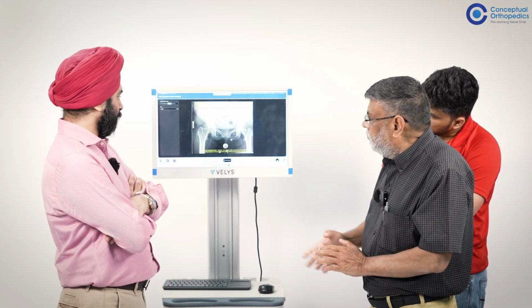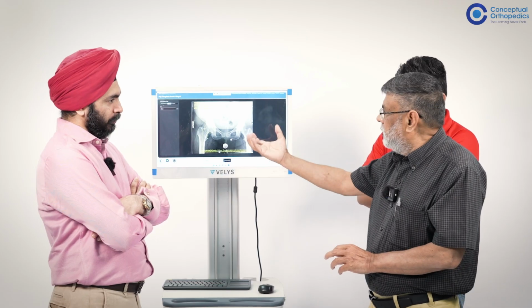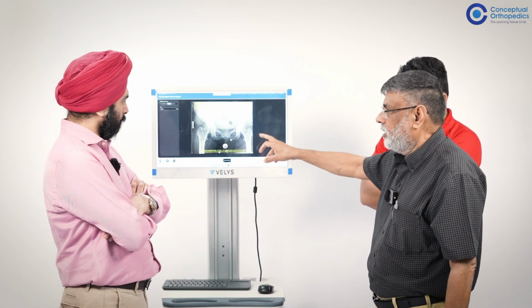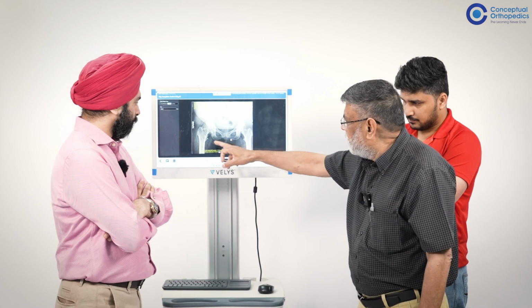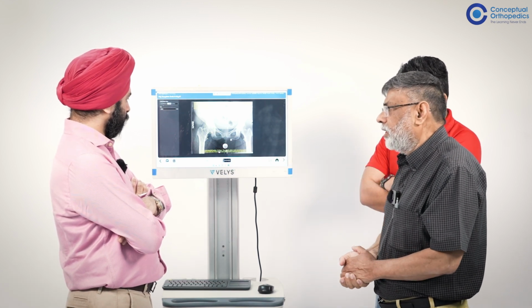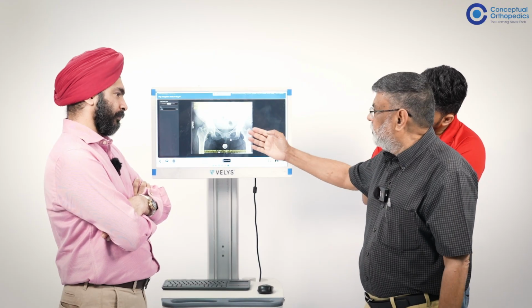If it is very deformed, like internally rotated or externally rotated, then the offset changes. Then you can't use that side; you have to use the other side. If you see the lesser trochanter normally, then you know the offset is right. The only thing you have to change is the leg length, to your favor. The first thing you will know is what the difference is. If there's a gross difference in offset, then do this.